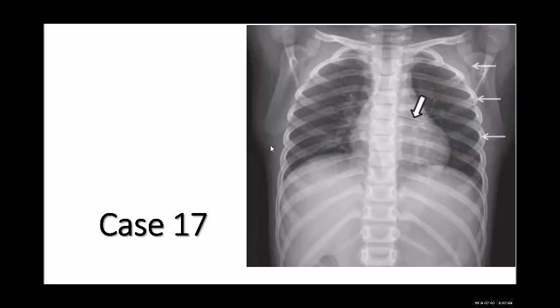And also, there is maybe subcutaneous emphysema. There is increased lucency on the left more than the right. So I won't say emphysema because I can see the lung tissue within it. You can see the lung tissue. Subcutaneous, I mean. Oh, subcutaneous, I don't see it. Where do you see it? The upper arrow. I don't see it, the upper one.